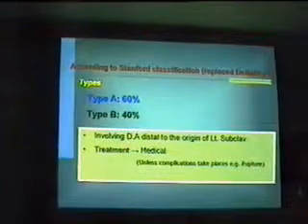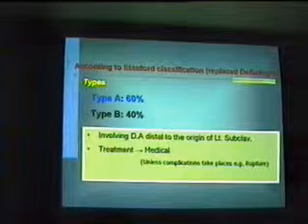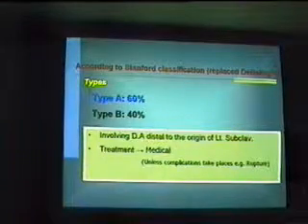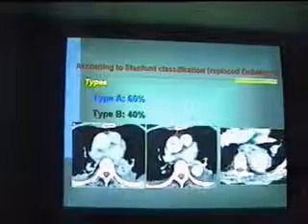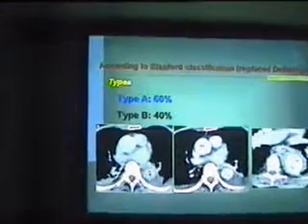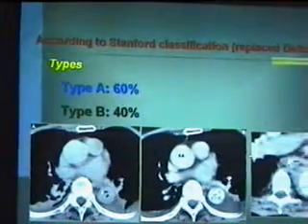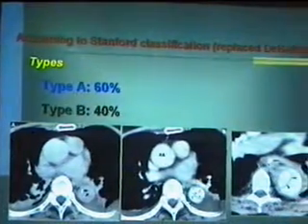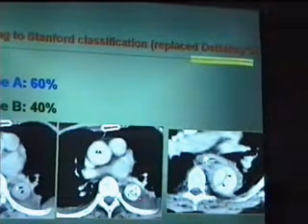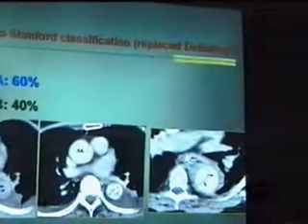Type B بقى involving the descending aorta distal to the origin of the left subclavian. يعني immediately after the origin of the left subclavian if I have dissection يبقى this is a type B. The treatment is usually medical unless طبعا حصل complications زي rupture. وده منظر التايب B. شايفين الانتمال calcification دي اللي displaced فعملت لي false وtrue lumen. شايفين الفولس ليومن عادة بيبقى هو الأنترو سوبيريور عادة. وهنا في الكونتراست الاثنين مالوا، إحنا ما خدناش حاجة بدري شوية عشان نشوف إن ده بيملى عادة قبل ده، الترو بيملى عادة قبل الفولس. وادي الفلاب وادي الكالسيفايد انتما اللي هي ديسبليسد على الفلاب وادي المنظر ده.